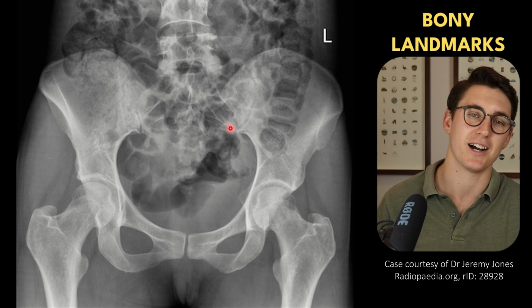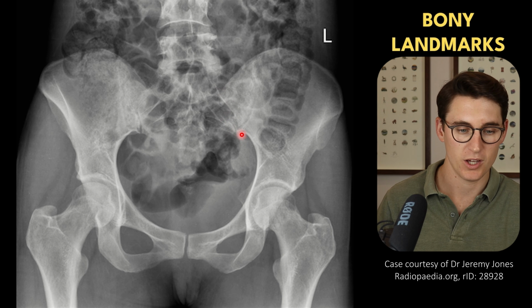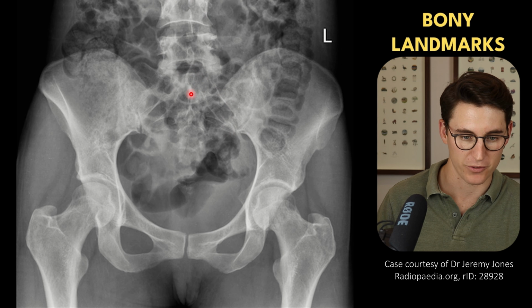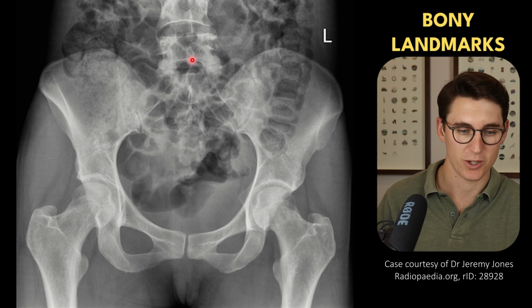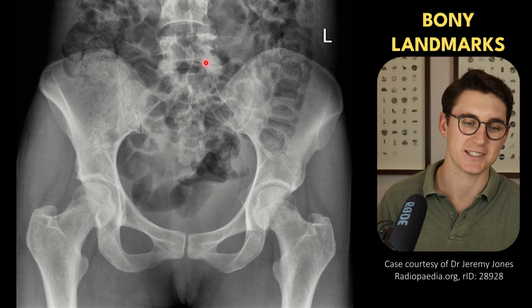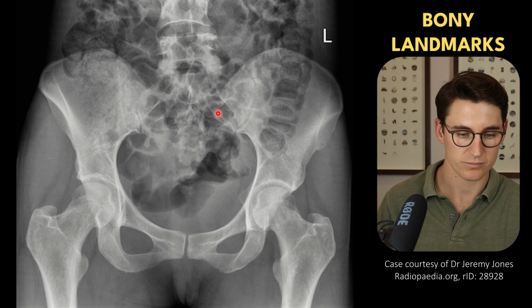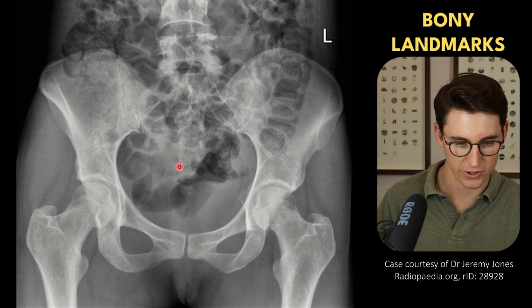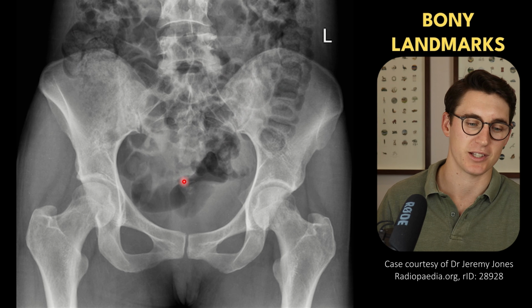There's our posterior superior iliac spine, and maybe this is quite difficult to see, is our posterior inferior iliac spine. We can see our lumbar vertebra here. We can see our L5 lumbar vertebra with its transverse processes here. Our intervertebral disc space. We can also see the vertebral spines heading out posteriorly there. It's quite difficult because of all the gas within the bowel here to see the sacrum well, but we can see our SI joint here, our sacroiliac joint with our sacral alar here. And further down we can see our coccyx bones coming down here.